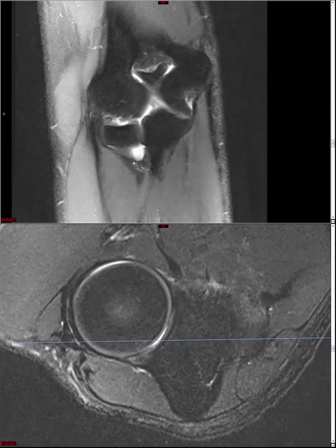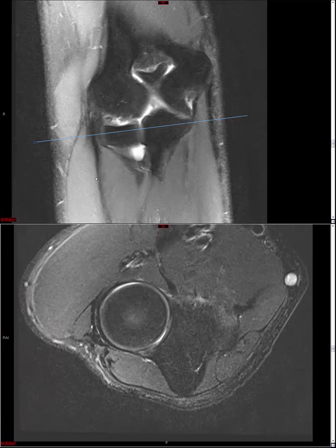Here is that lateral ulnar collateral ligament in coronal perspective, and if you read articles on this, they'll probably show you a picture like this when they're talking about the lateral ulnar collateral ligament. You can just imagine how it prevents this radial head and neck from slipping out this way, posterolateral. Okay, so that's the lateral side.